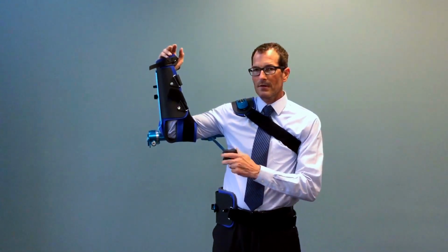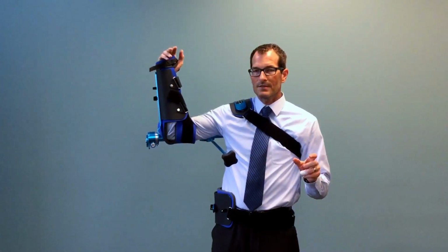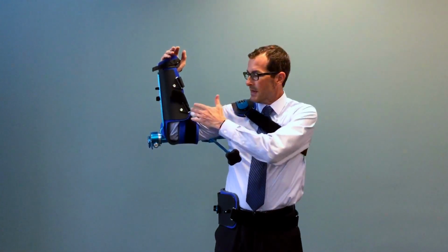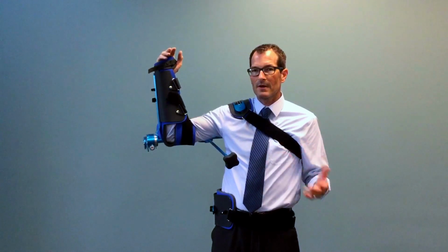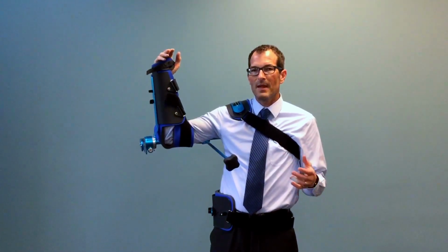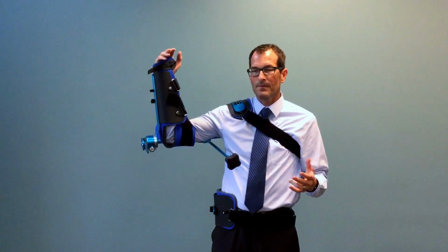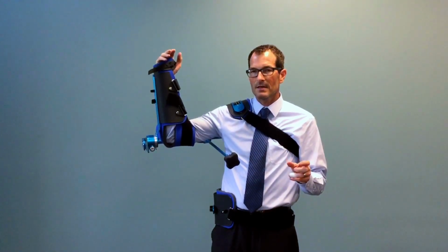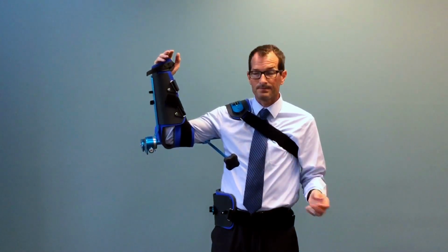One of the other features that we intentionally designed into the Stat-A-Dyne shoulder is this elbow X-strap system. As you can see, it harnesses my arm very well. We knew that if the patient did not relax their pectoralis and their shoulder girdle, they would never truly be able to isolate their soft tissue well when trying to cause plastic deformation.